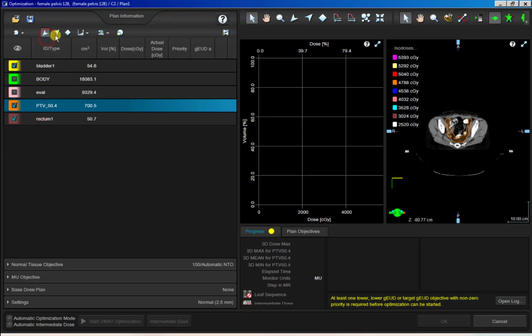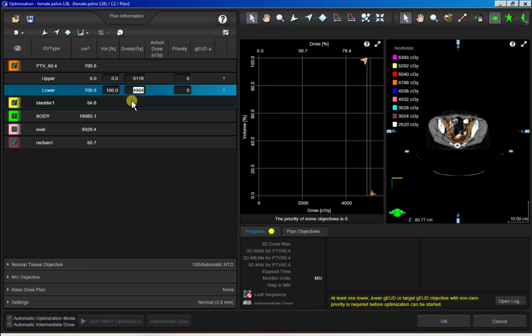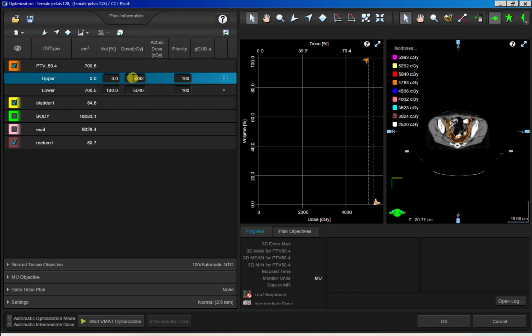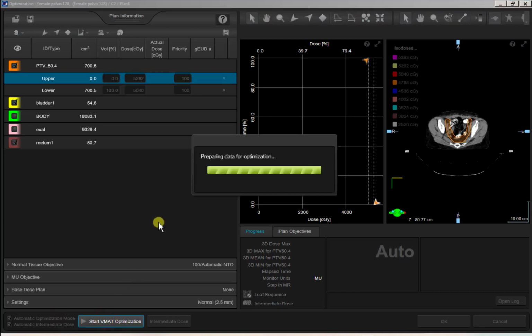Start with our PTV: 5040, 0 at 5292, priority at 100, NTO at 100. I'm going to go ahead and get started.